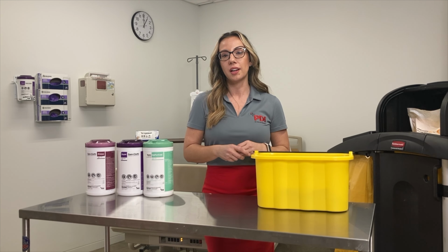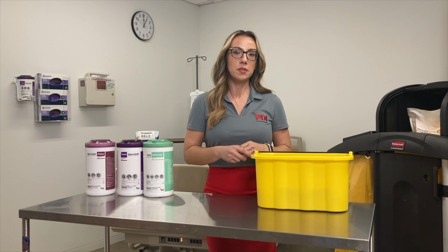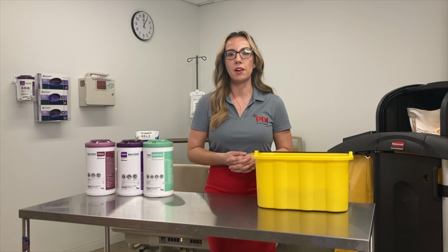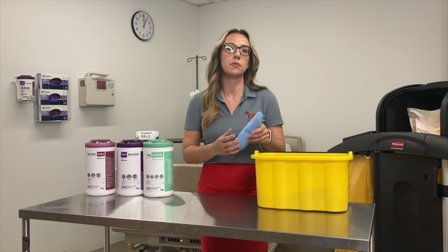This can be challenging. Chemical dispensers can be faulty, and sometimes you're not getting the right amount of liquid. One way that hospitals combat this is they use test strips to test the liquid, but this is an extra step and can lead to human error. And it's not only the liquid that you need to be concerned about, you need to look at your tool, the applicator. Again, a microfiber cloth.